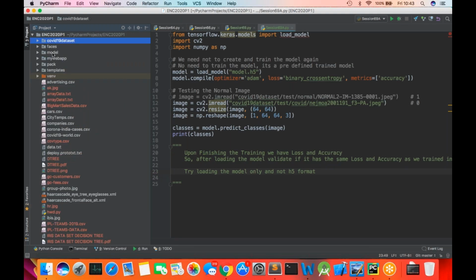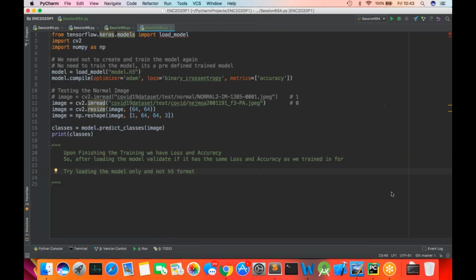So till here, I hope everyone is good to go. Now I'm going to put up so many things all together. What I'm going to do is fuse the Flask application along with this image classification problem statement. So we'll choose one image from the user, and we'll tell him whether this is a COVID infected image or whether it's a normal image, right?